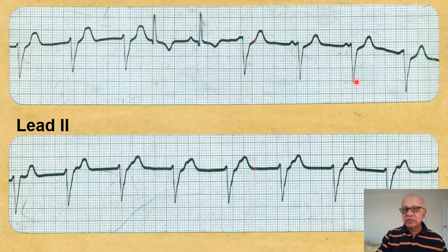Now, what caused this arrhythmia? That was my third question. The patient had a thrombolysis with streptokinase, and this ECG was taken after the thrombolysis during the monitoring in the cardiac ICU. Now this ECG was recorded about 30-35 years ago, long ago, before we had the facilities for angioplasty, right? That is why we gave him thrombolysis with streptokinase.